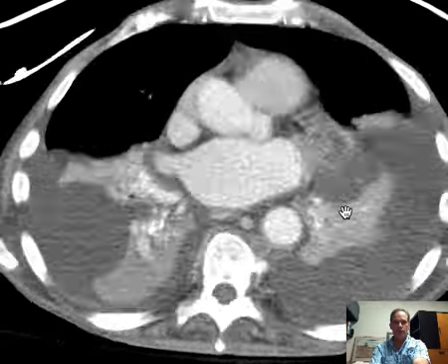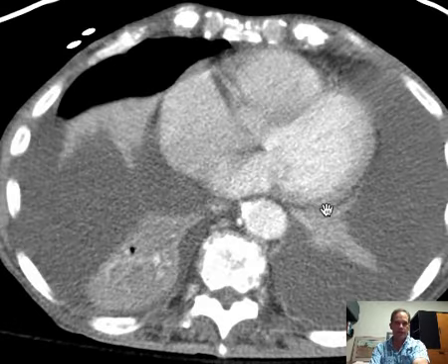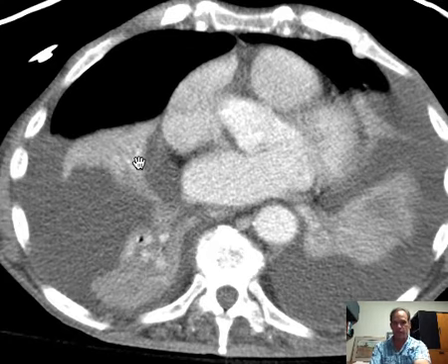Well, on the right, we know we have a middle lobe, and let's see if we can see that. Well, here's the right lower lobe. This should be right middle lobe. Of course, it's going to be more anterior, and in a normal situation, it would be abutting the right margin of the cardiac silhouette. In this case, it's pulled away from it because of this atelectasis.